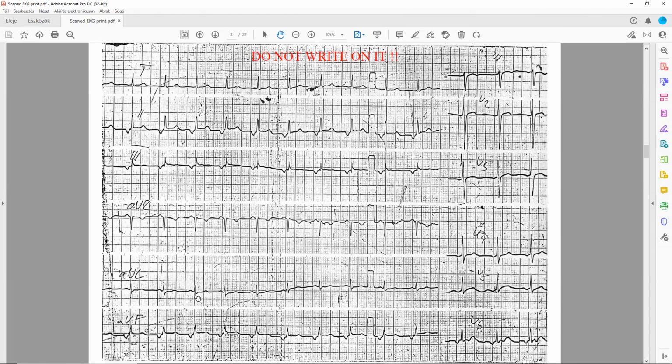So it's around... it's a normal axis. Yes, but how much? It's around 60.